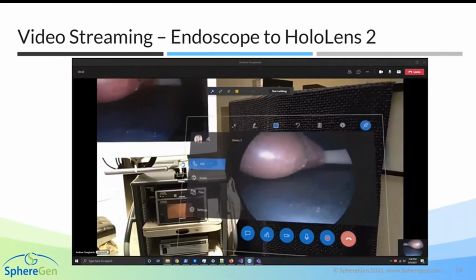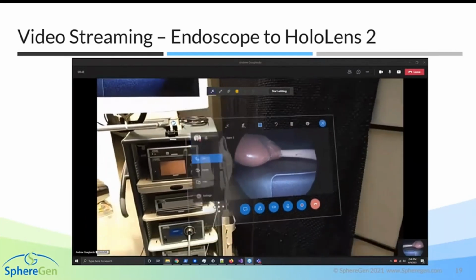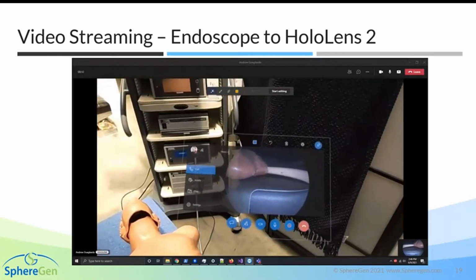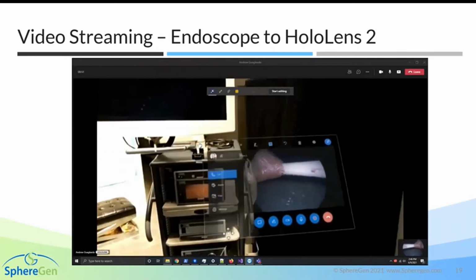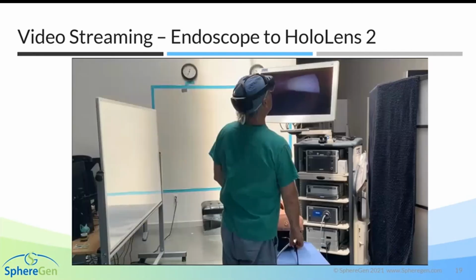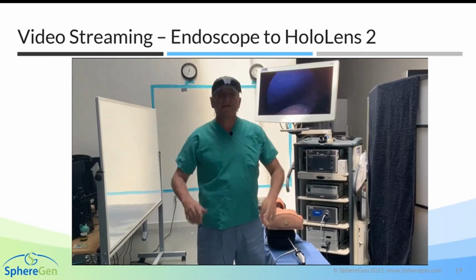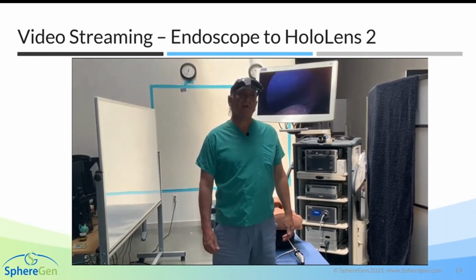That is absolutely as good a visualization, I think, as you're going to need or frankly get from any kind of system. But again, the advantage being I can put this image anywhere. And we can extend this to all sorts of devices. We can feed essentially any video feed into this headset, and you can have multiple feeds coming in at once. So you could have a laparoscopic feed coming in, you can have vital signs feed coming in all at the same time. I think I timed that well.